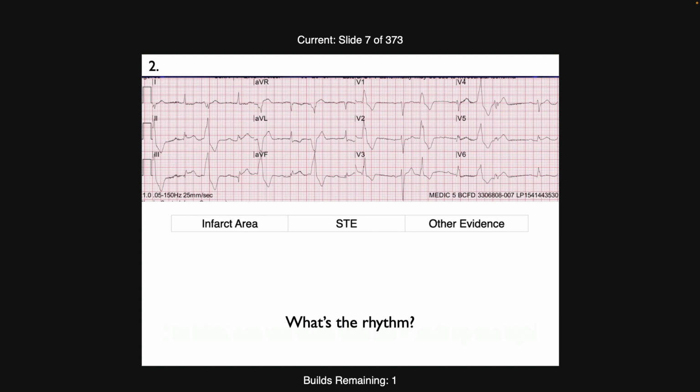So for example, here, this PVC and these PVCs all have ST depression, okay? Doesn't mean that there's ST depression in lead 3. It's because it's a ventricular beat. And I'm sure at this point you can all picture, remember we talked about some ventricular beats are mostly positive, or in this case, all positive with a flipped T. Those are the ones that have ST depression.